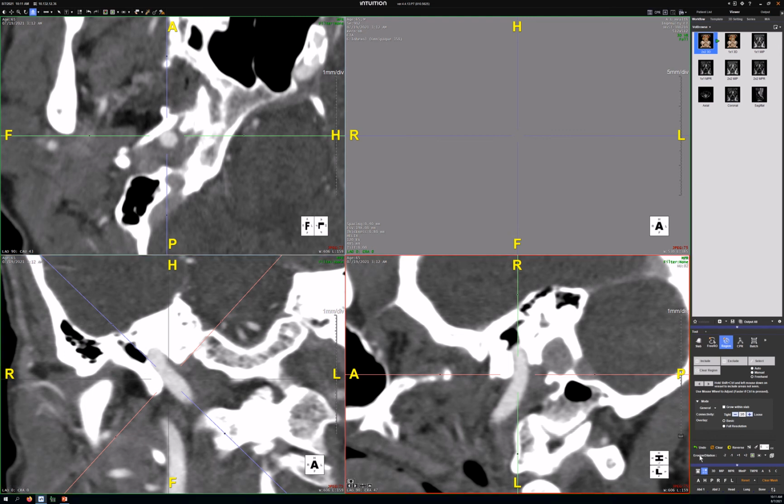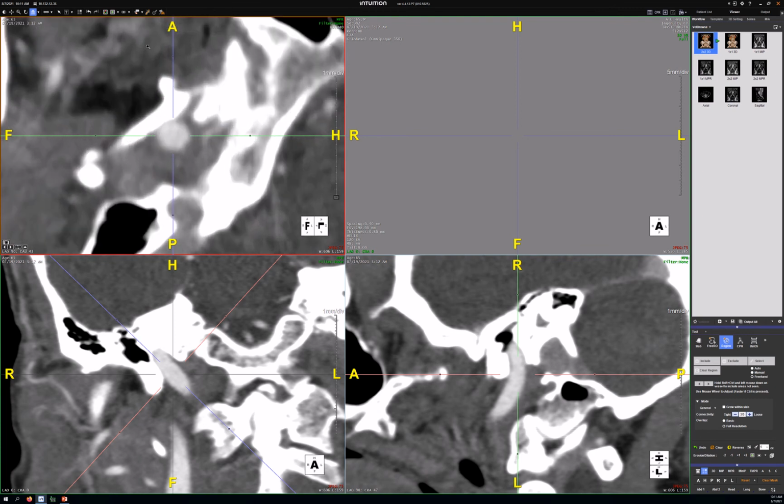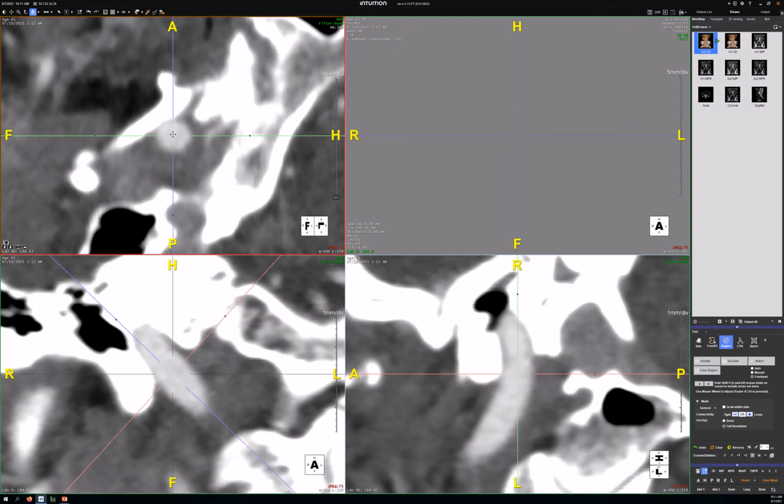If you go back to here, click on full resolution, and it's not going to matter here because freehand is always a circle, whatever mode you're in. Okay, so up here, make sure you're absolutely centered in the vessel with the Alt key. I'd make it even bigger. Middle mouse hold, push forward until you can see your voxels. You don't have to hold down Alt to. Oh yeah, there we go. We're in the center.